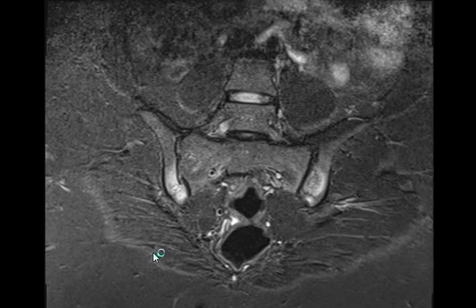Shiny corner is an early sign, one of the early signs of ankylosing spondylitis. It's an early process, it's starting. Maybe if you wait, it will change, like osteitis condensans ilii. This is a radiological sign, on CT or X-ray, not on MRI. Okay? Good. Thank you. Next.